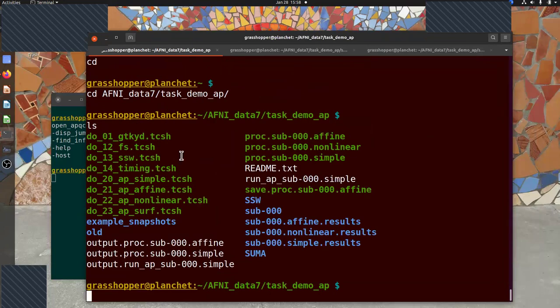And so you should see these do scripts that we ran one of before. I'll note that here also the @SSwarper command we ran to generate the SSwarper data is here. We even have a FreeSurfer command that ties in with this data for our surface processing. So you can see how we do the surface processing that we don't have time to cover in this boot camp. Even how we made the timing files is stored here, so you can get that kind of extra information.